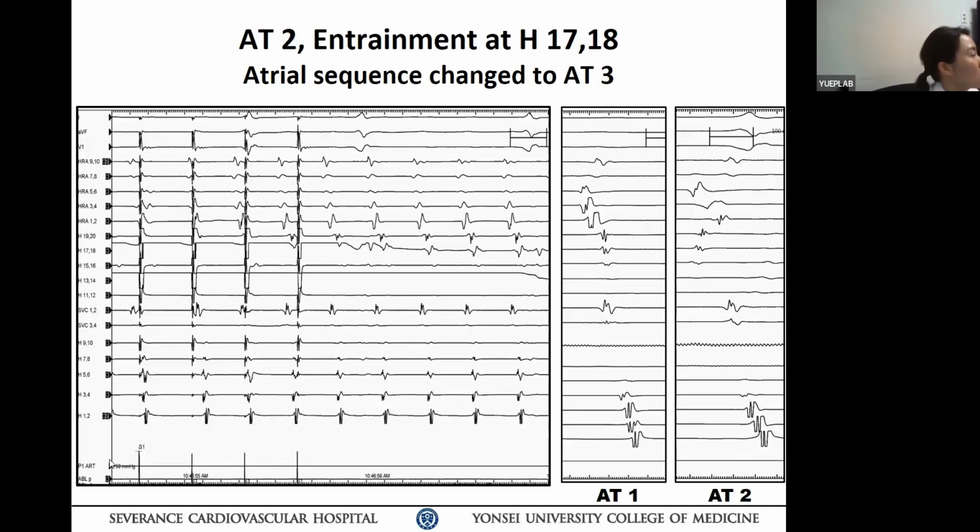In this case, is it even capturing, because the pacing spike is falling after? In this slide, is it capturing? I don't think so. No. I would like to say one more thing. Can you show me the previous slide?